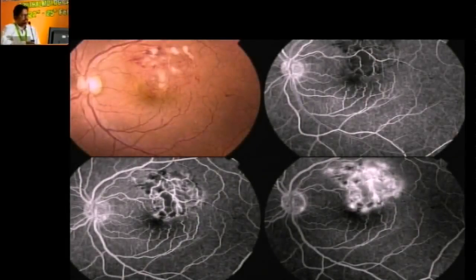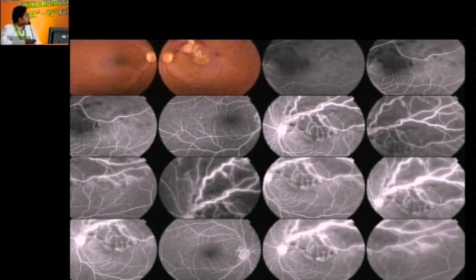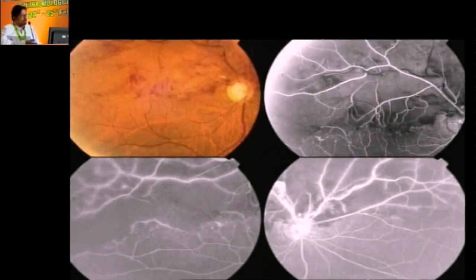And also in vein occlusions, you can look at the amount of involvement, how much is involved in the fovea, which helps you to prognosticate. And if you plan to do laser, if there's NVE here, you can look at the area which needs to be treated, and it can also help to differentiate between hemi-CRVO and large BRVOs.